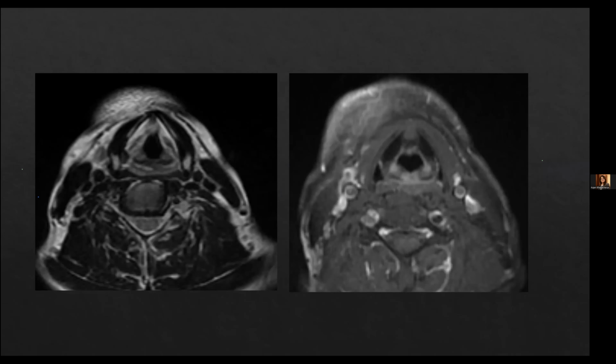First is when we are looking at cartilage involvement. Sometimes, if CT is not giving you a clear picture, most probably in cases where there is inhomogeneous ossification of the thyroid cartilage, then to look at the intracartilaginous fat, which we are seeing here in this case, this fat is very nicely seen on MRI. If we see soft tissue intensity in that region, then we can say very clearly that cartilage involvement is present.